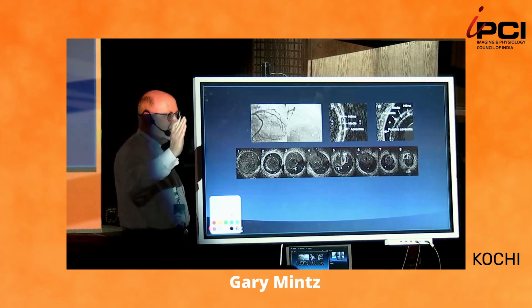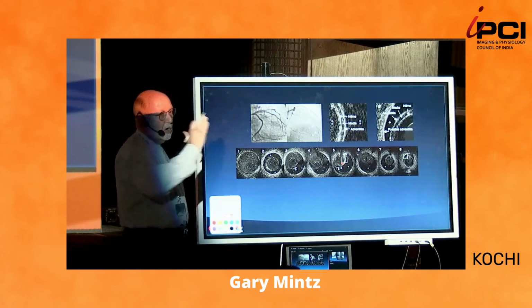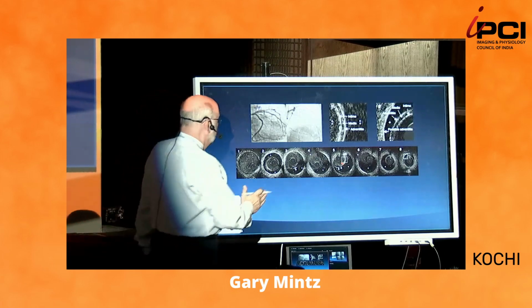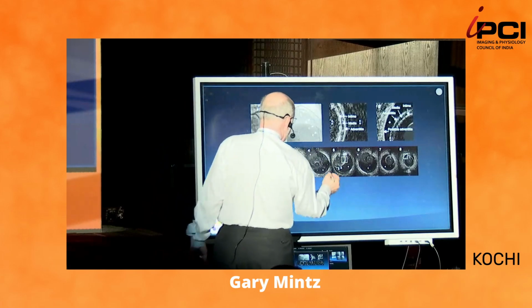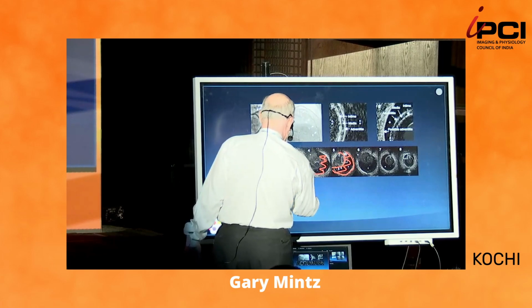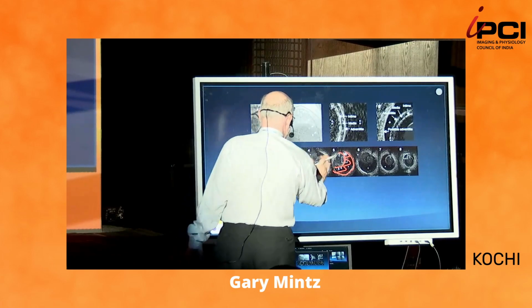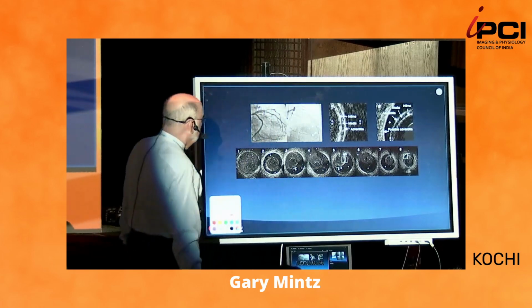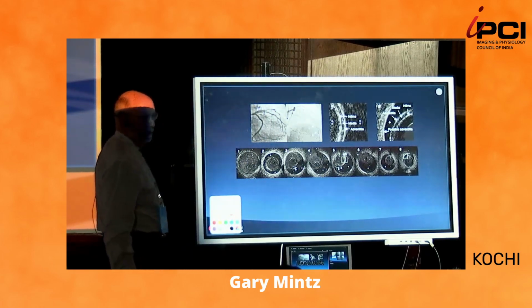So that part of the external elastic lamina goes in, part of it goes out. And we see this consistently with the HD IVUS. And you can see, obviously, again, the collapse of the vessel, the adventitia outward, and there's some hematoma, and so on. The one thing that you'll see better with OCT is the entry and exit point.